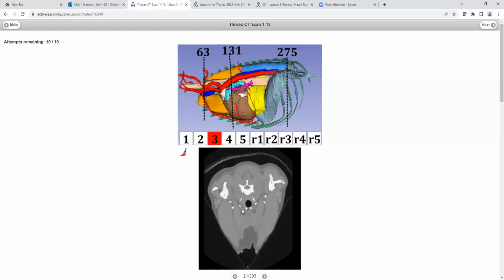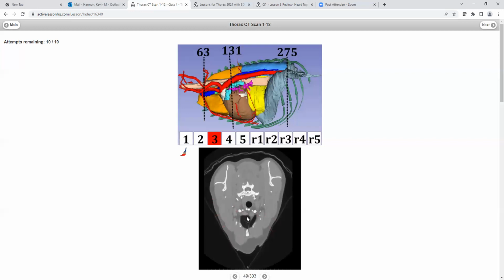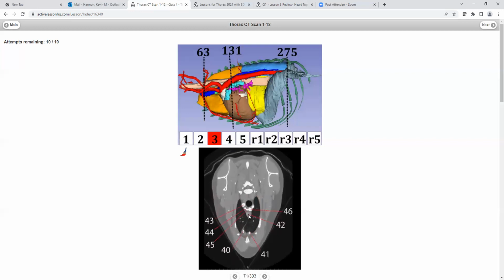So let's follow where this goes, and I'm going to keep my stylus on it. We don't know for sure what it is because the arteries have the contrast medium, the veins don't yet because the contrast medium hasn't been enough, but we're going to follow this caudally, and it joins together. Look at that. It just joined together with this other structure over here from the other side. So this is animal left, this is screen left. So it joins together and it comes up and, oh, joins this great big thing, number 42. What is that big vessel?